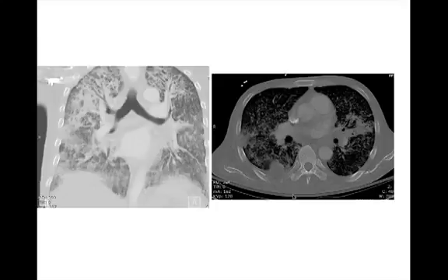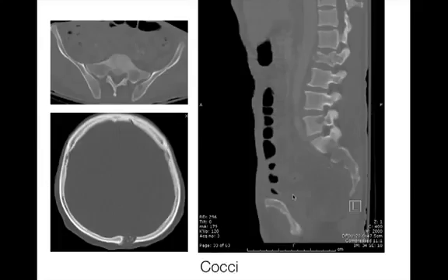This patient was very sick and they were septic and they cultured these things and these were cocci. So this was diffuse osteomyelitis, diffuse systemic coccidiomycosis infection causing osteomyelitis and mimicking metastasis.